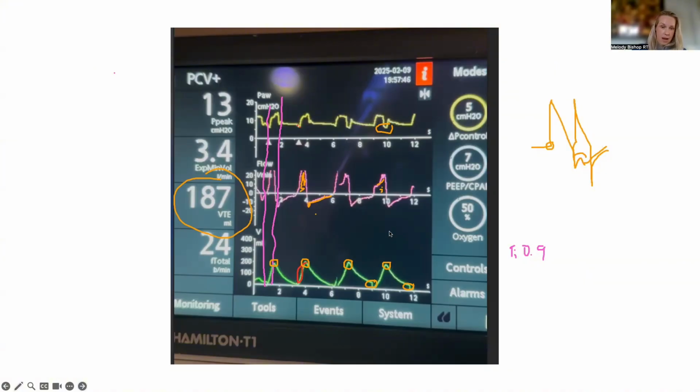I think you broke it down pretty good. From what I remember about this scenario, the patient was a difficult to synchronize patient with a neuro-based head injury. The spontaneous breaths you see there were what the patient's baseline efforts looked like. They were trying to make the patient more comfortable and were giving more and more sedation. Then they were having this differing morphology, with some spontaneous breaths but then some pauses in their neurodrive to breathe, so a machine breath would be triggered and would invoke this reverse trigger phenomenon. Everything else you mentioned was spot on.